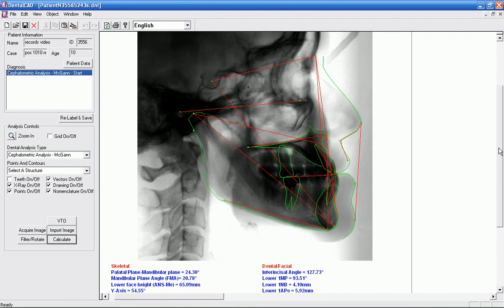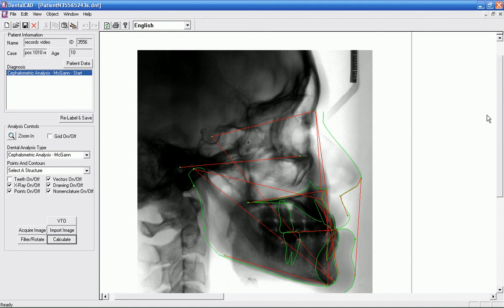Oh yeah, let's go look at this calibration. And I can see the lines here. And it looks like I have maybe 15 millimeters or so that I can work with, maybe a couple more, but let's just go for 15 millimeters. That seems simple enough. Now what I'd like to do is get something that is measured.